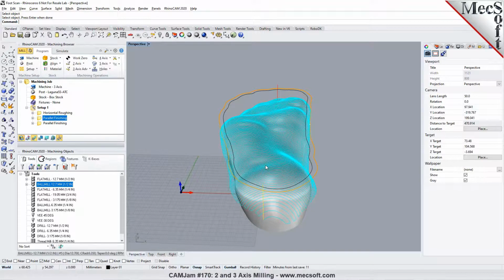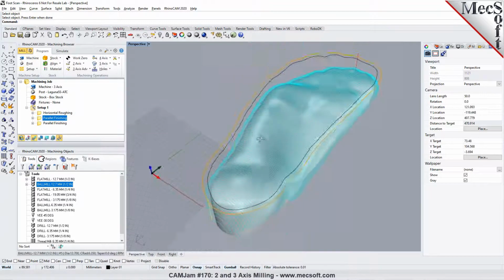Any other questions on the demo I can help you with? Yeah, obviously you showed us how to cut the bottom portion of the foot, and we want to do the same thing. We don't need the toe area of the foot. That's excess that we wouldn't need to generate some orthotics.